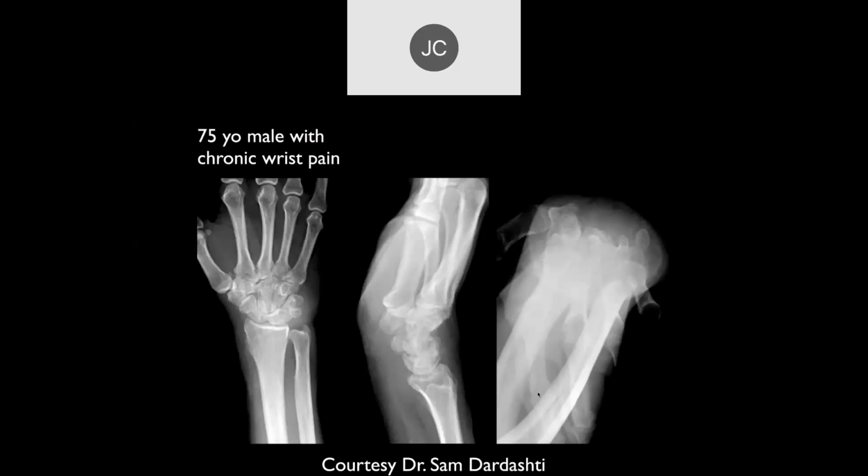Okay, Tayson. 75-year-old male with chronic wrist pain. Some irregularity of the cortex there on the radial side of the radius, maybe? Okay, a little bit in here. Probably some soft tissue thickening also around the carpal bones. Kind of irregular density within the bones themselves.